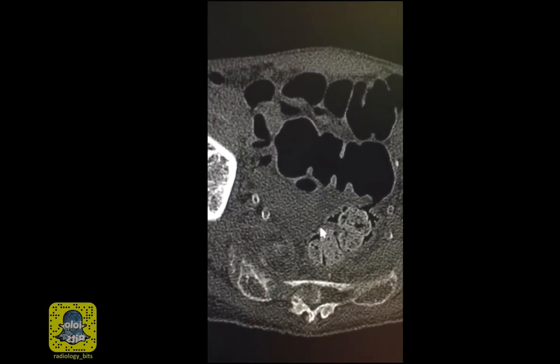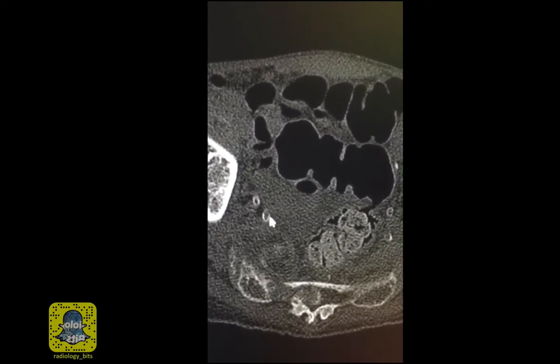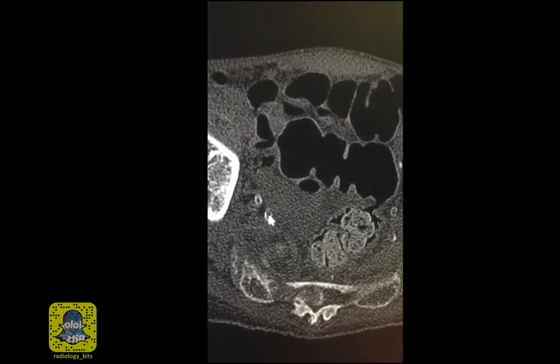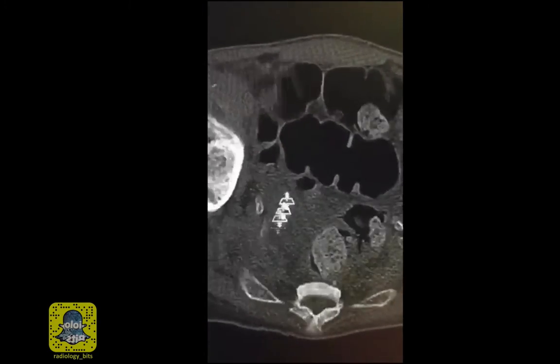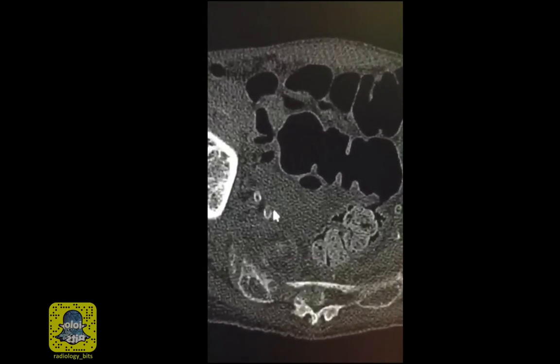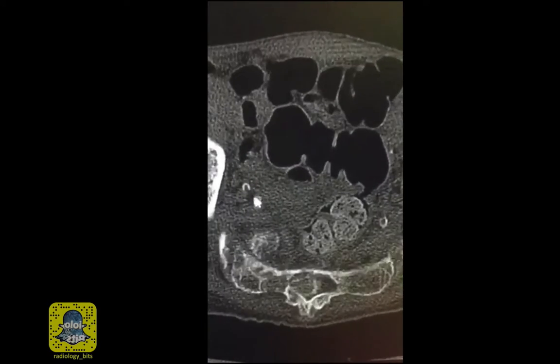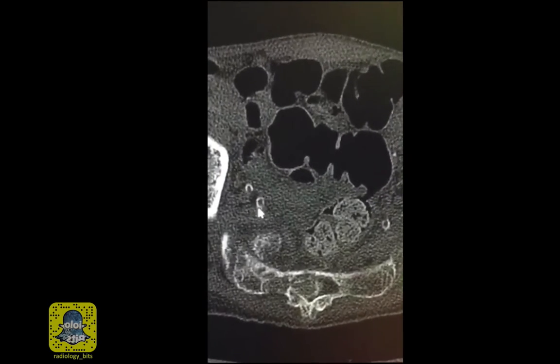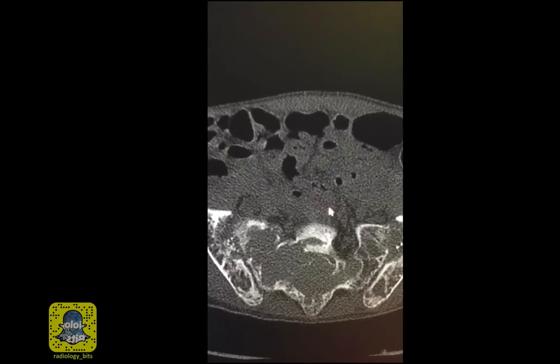Although the patient is young, the hint for chronic renal disease is in front of you when you see calcifications of even the smaller vessels. So severe atherosclerotic changes of all of the large and small vessels, that's a good hint to long-standing renal failure. This is even more the case when this is seen in a young patient where atherosclerosis would be unexpected.